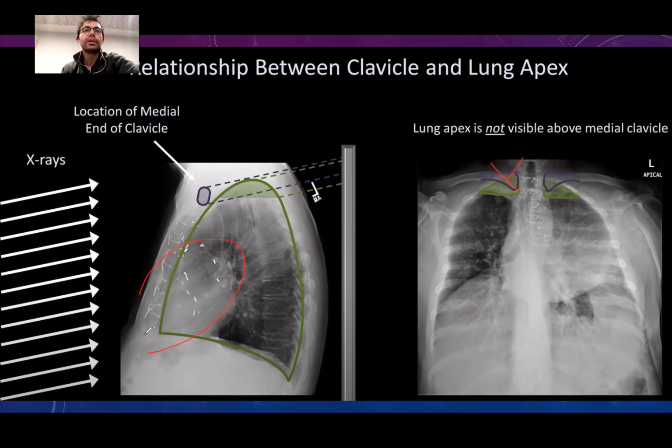Because when I'm shooting, the heart right in the middle part of the lungs, now I can see the heart in a very disoriented manner. Also, the shape of the diaphragms is changing marginally. I cannot see the left border of the diaphragm, so I can hardly see the costophrenic sinus here. Here I can see it, but many of the lung areas are also compromised because of the diaphragm superposing to these lung tissues. So the angulation can really distort the image.